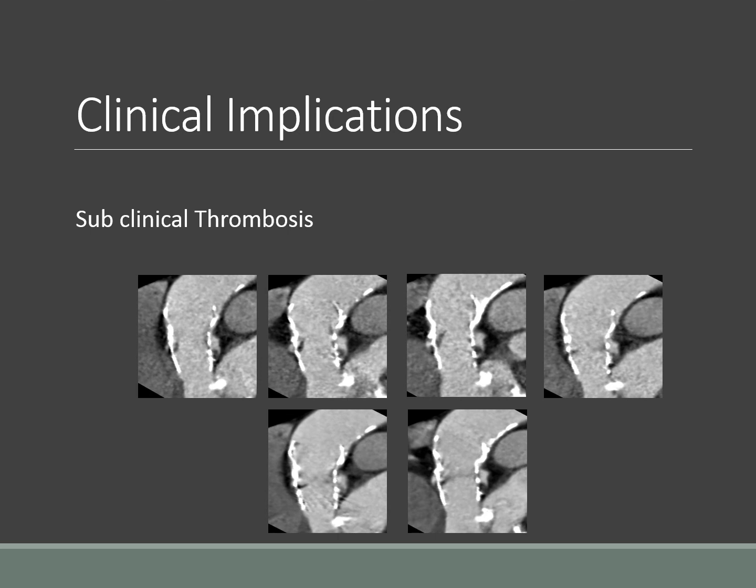As you may see in this case, for example, there is a hypoattenuation along one of the leaflets. However, across the cardiac cycle, you can see that the TAVI leaflets open widely in systole and close freely during diastole. This reflects a subclinical thrombosis.